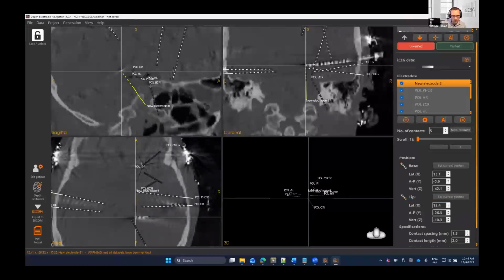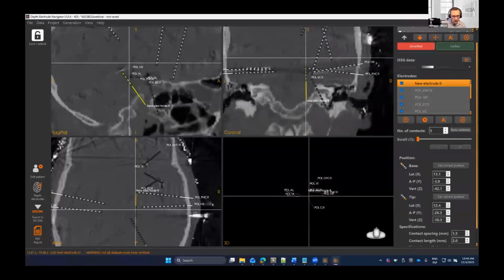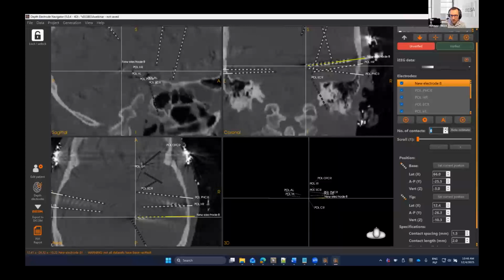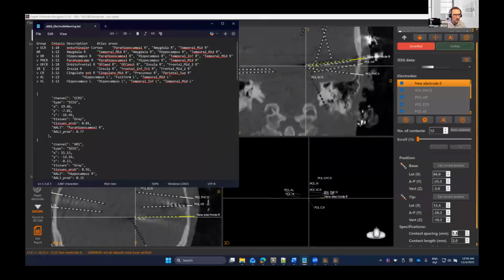So this is the tip. And again, we just need to go a bit higher to find the stick base. And again, 12 contacts and spacing. And the name of it was AR as far as I remember. The missing one. Oh, we are still missing one.